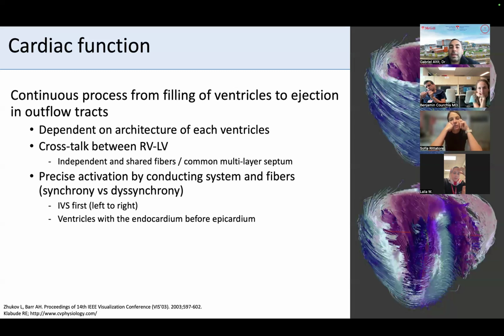And it's well described that they can develop certain degrees of cardiomyopathy, and they get something called EFE, endocardial fibroelastosis. Basically on echo, it looks very, very bright because it's areas of fibrous tissue and it's very echogenic. So it rebounds a lot of the ultrasound waves. You see these very bright white layers around the muscle, and that's not muscle tissue. So first of all, it doesn't conduct electricity. On top of it, it doesn't participate in contraction.